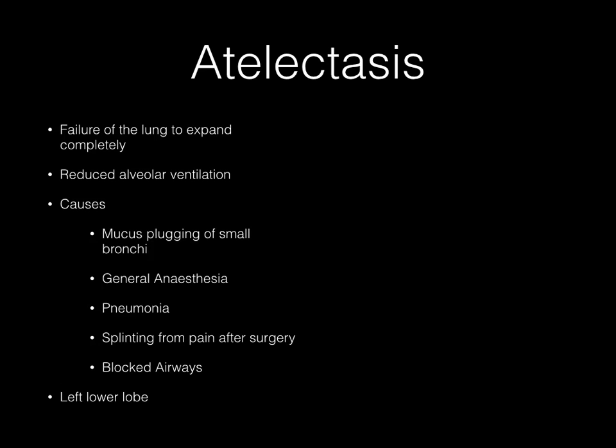On occasions, left lower lobe atelectasis is not an uncommon thing to see in most of the ICU patients.